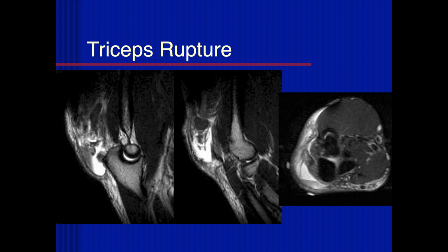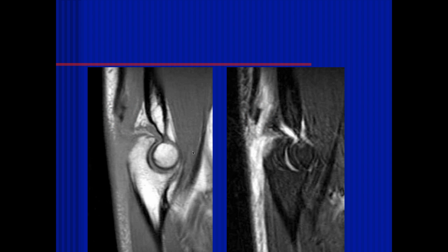When you say bursitis, that's not quite where the bursitis is. It would be superficial to the muscle and olecranon. So this is a hematoma or fluid of one kind or another. Yeah, right. Actually, what do you think?